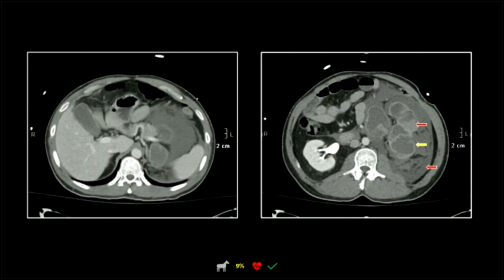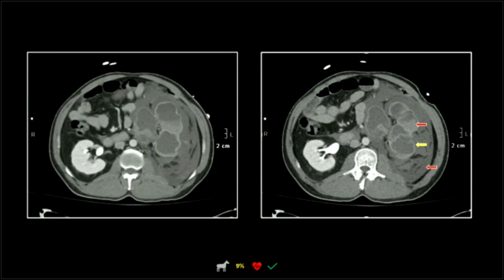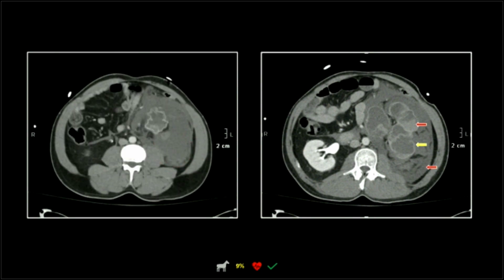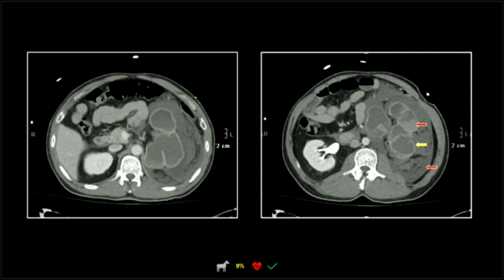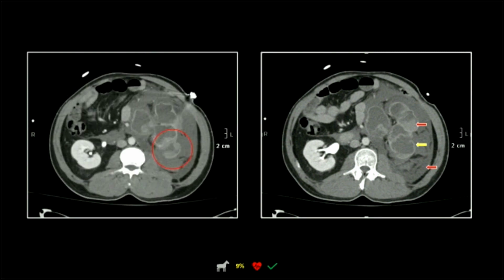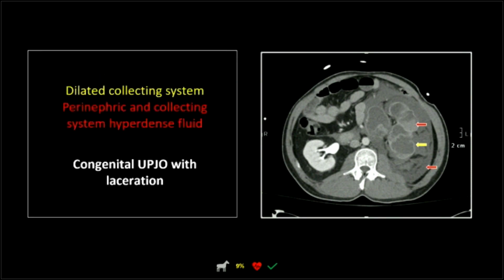So, you know, this would be kind of overwhelming to initially open this up and to never have seen this. So I thought I would put that in there, that this, again, it's a chronically obstructed kidney, which without all the trauma and the hemorrhage, you probably could have called. But you open this one and say, what is going on here? And again, there's the actual extravasation.